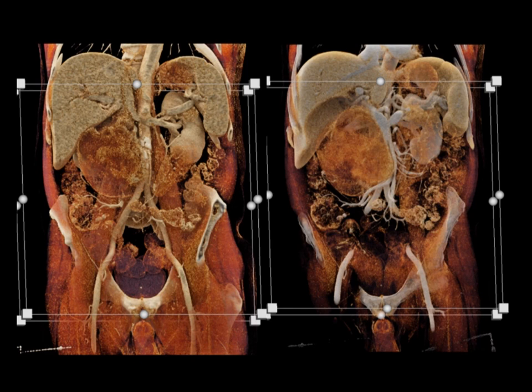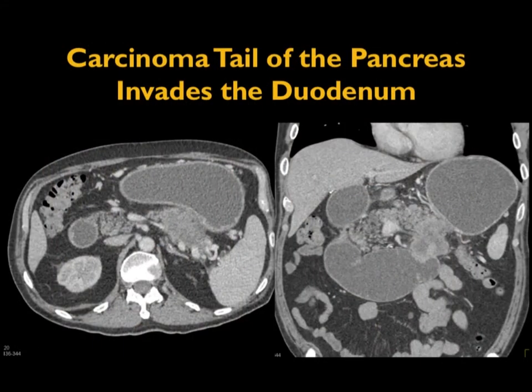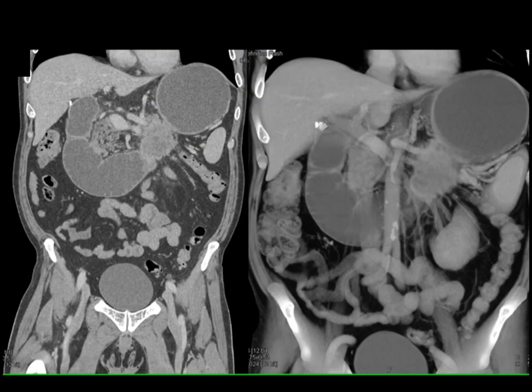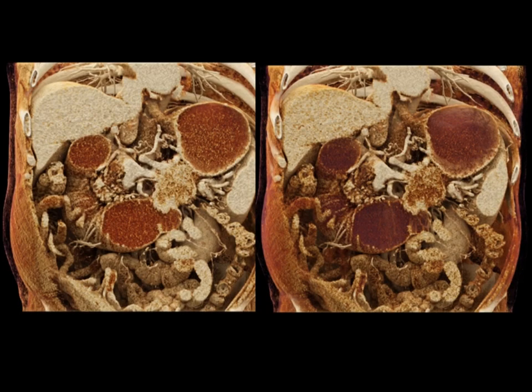So with direct extension, here's a good example, carcinoma of the tail of the pancreas directly extending into the patient's duodenum. Beautifully shown there, or on the coronal views, or in the volume rendered and cinematic views. But you can see this bowel obstruction, there's a mass. The patient's pancreatic cancer's presentation was small bowel obstruction. An unusual presentation, but we've seen many cases of that.